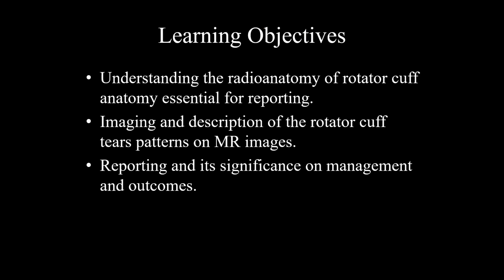My paper is on MR imaging of rotator cuff tear, what to report, and how it is clinically and surgically relevant to the surgeon. Learning objectives of today's presentation are understanding the radiological anatomy of rotator cuff, how to describe the rotator cuff tear on MR images, its reporting and significance on management and outcomes.